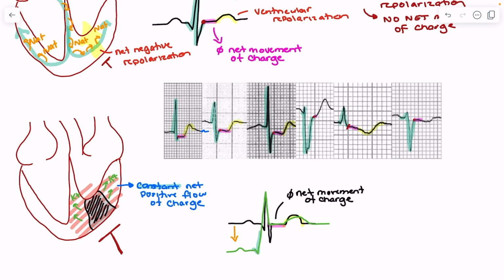So I'll be looking again at my QRS complexes for where do I see the QRS complex no longer positively or negatively deflecting from baseline. Where does that period of rest start, followed by the T wave? And as a result, the process looks the same of identifying the J point, which in this case is right here.